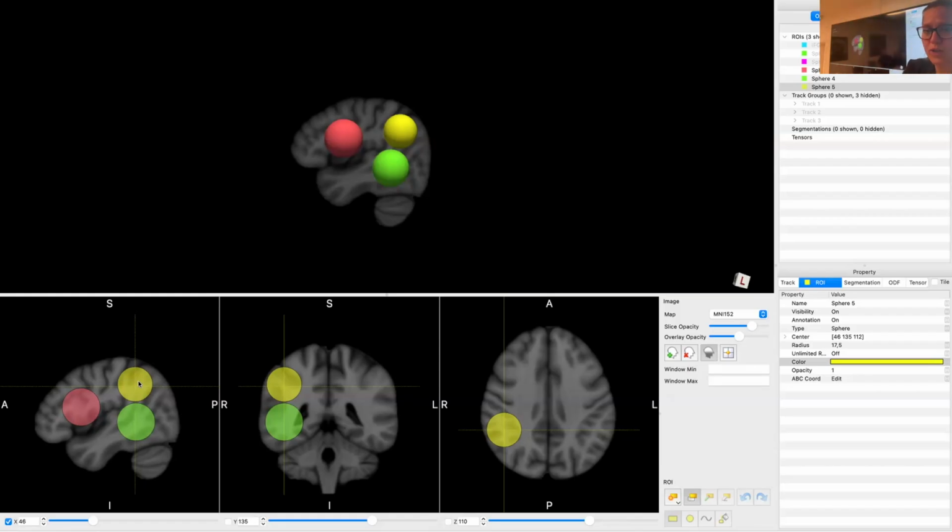So if you were interested in doing that, if you go to the region of interest setting, there is the option from nifty or analyze image. So if you have a parcellation of the MNI brain, you could also upload a lesion mask for the motor cortex or the somatosensory cortex or whatever, okay? So that's why we use the MNI data for the training data set, but you can do exactly the same steps that we've done now in the native space of any participant. Yeah? Okay, who's ready? Who has an arcuate?